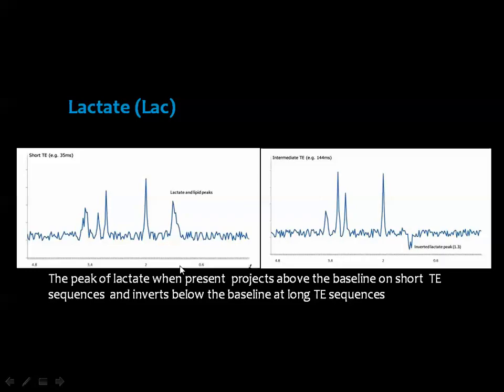Now, the lactate peak has two apices, and characteristically, whenever you use the long TE spectrum, the lactate peak will be inverted below the baseline.